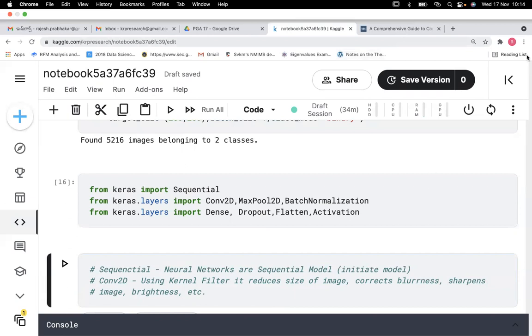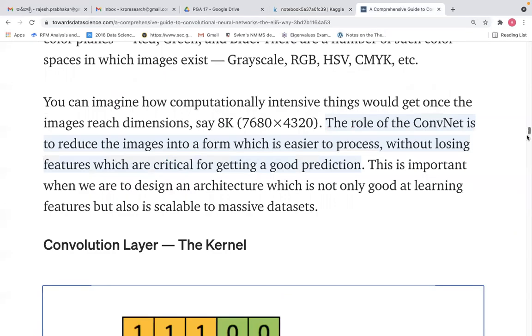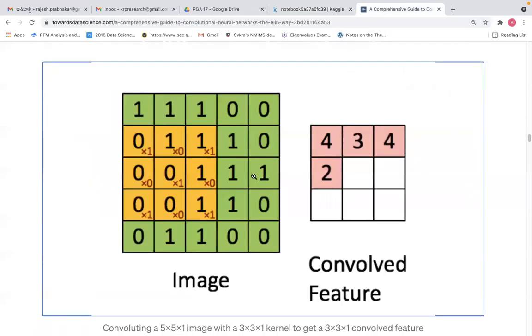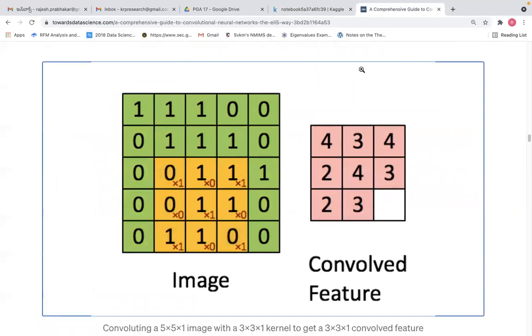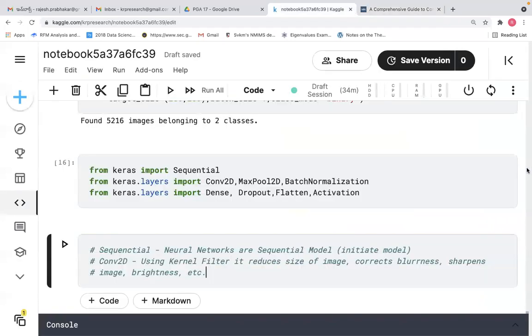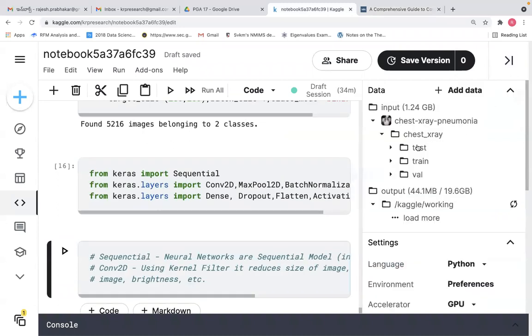Yes, sir. The convolution layer will work on this. Sir, please tell the imported path. Okay, one second. The import path is this, right? Go into Add data and copy this path. Here there is copy file path. Can you see it, Shivanand, in Add data?